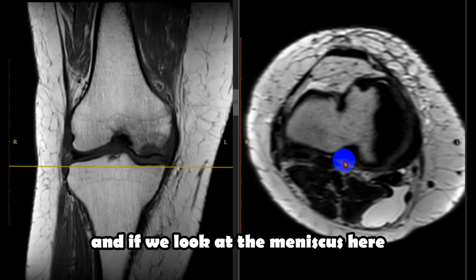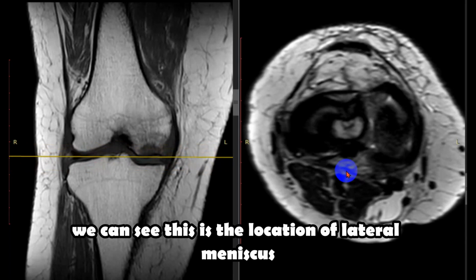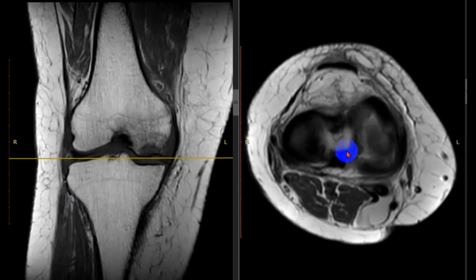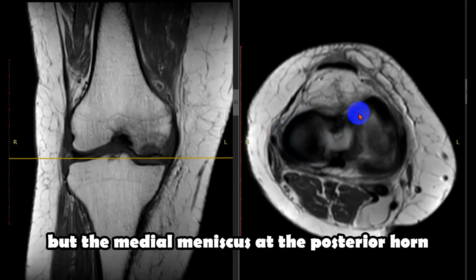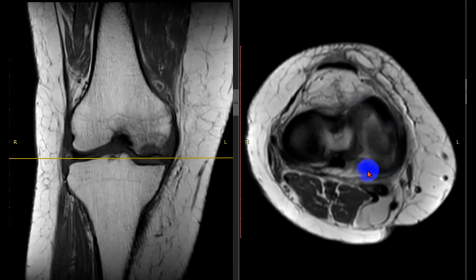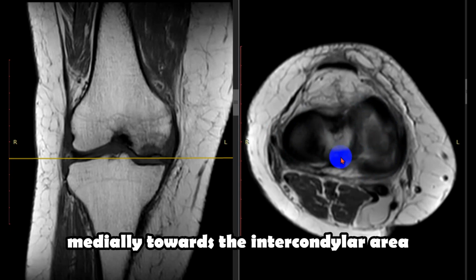And if we look at the meniscus, here we can see this is the location of lateral meniscus and this is the location of medial meniscus. For better visualization, now we will look for proton density weighted image. Here we can see the lateral meniscus is very nicely visualized here, but the medial meniscus at the posterior horn, there is tear within the posterior horn of the medial meniscus. The part of the meniscus is displaced medially towards the intercondylar area.